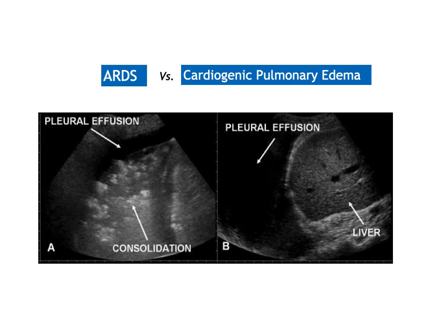So consolidation is typical for ARDS, and important to note, in typical classic COVID-19 patients, we often do not see large lobar consolidation unless they are extremely sick. So among those clinical phenotypes who are very sick and hypoxic and have true ARDS, you will see lobar consolidation, or if they develop superadded bacterial infection.